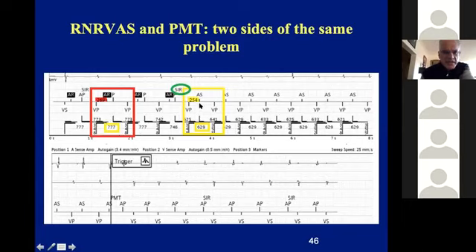When the refractory period gets a little shorter, from 269 to 254, retrograde conduction comes out from underneath the PVARP, and then it is sensed, and then it triggers PMT. So a slight change, and this all happens because of the sensor indicated rate. It's slightly faster, the patient is probably exercising, so conduction changes.